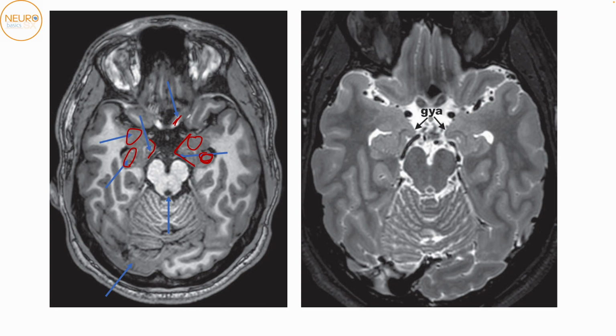Okay. Then here is the beginning of the fourth ventricle and the cerebral aqueduct. There's a very T1 iso-intense structure located over here. This is your transverse sinus. You can compare it with T2 imaging. It is quite hypo-intense on T2. So this is the transverse sinus and not part of the occipital lobe itself.